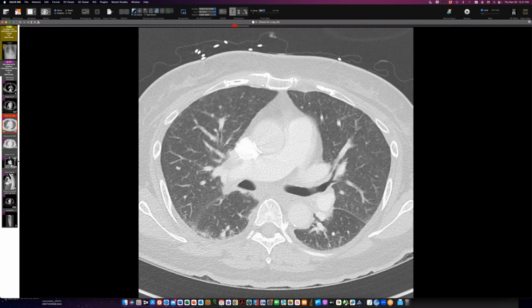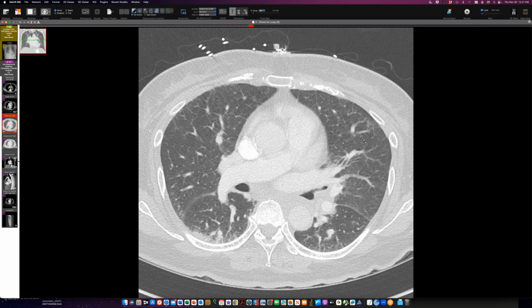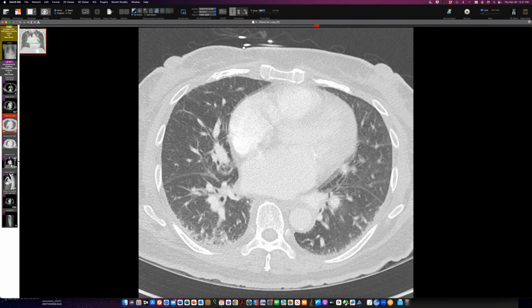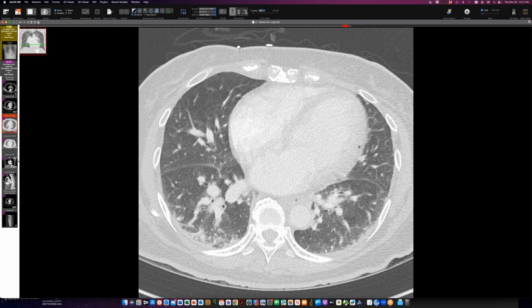And this is meaningful here when you see it anterior like this, not in the scrunched parts of the lung where there's dependent atelectasis that can sort of force the vessels against the pleura. These vessels are volunteering to go out to the pleura. That's a very good sign for hepatopulmonary syndrome. So this person has CT findings that go with hepatopulmonary syndrome and then definitely has hepatopulmonary syndrome.